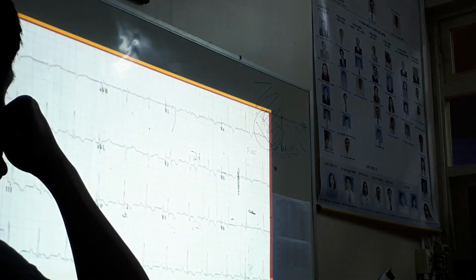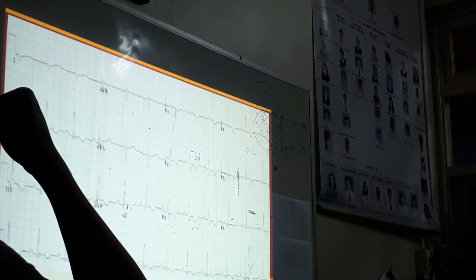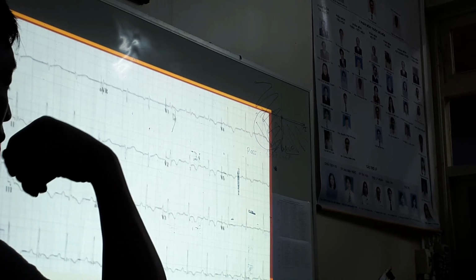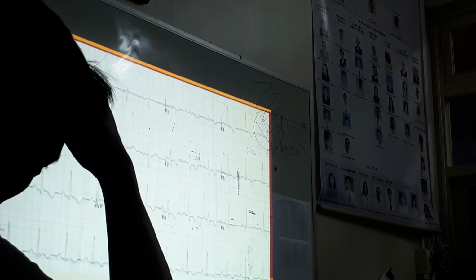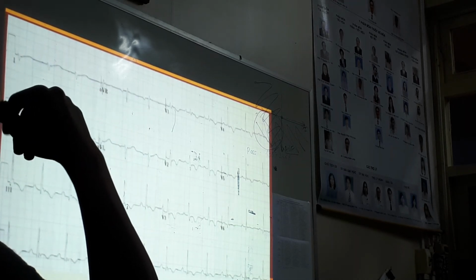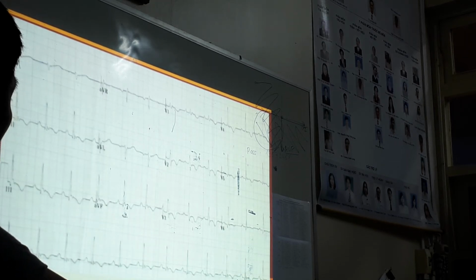Oh, also, do you know what other EKG gives you notches here? You'll never see it in Vietnam. Hypothermia. Yeah, hypothermia, Osborn J-wave. That's one. There's another one too that gives you a notch right after the QRS: benign early repolarization with ST segment elevation.